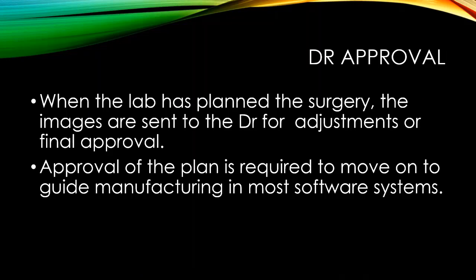So now the laboratory has gone through the steps and they've proposed a treatment here. They've helped plan a surgery. Now everything is sent to the doctor for adjustments or final approval. Obviously, this is not in every laboratory scope. As we talked about earlier, the importance of good communication with your laboratory is critical, but this is within many laboratory scopes. And so having this communication for them to understand what that end result should look like, you need to be involved in that process with them.